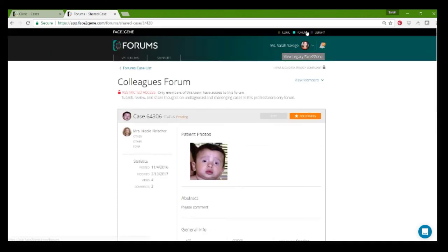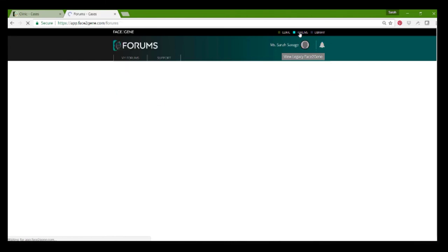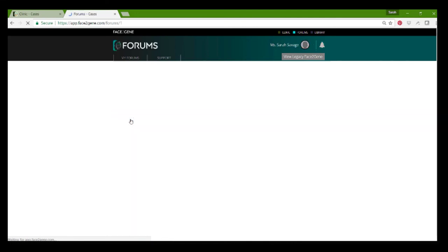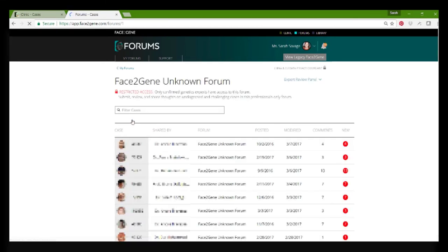You can access your forums by going to the forums link at the top right of this view, and you'll see on this page any forums that you are included in. So in my case, this includes my team forum, the unknown forum, and several other forums. The Face2Gene Unknown Forum is a really interesting way to work together with colleagues around the world to review your case for a clinical consultation or even to help others review their own cases.